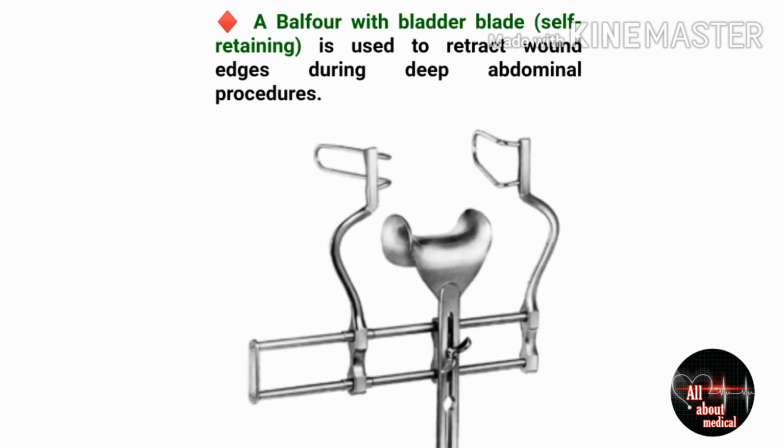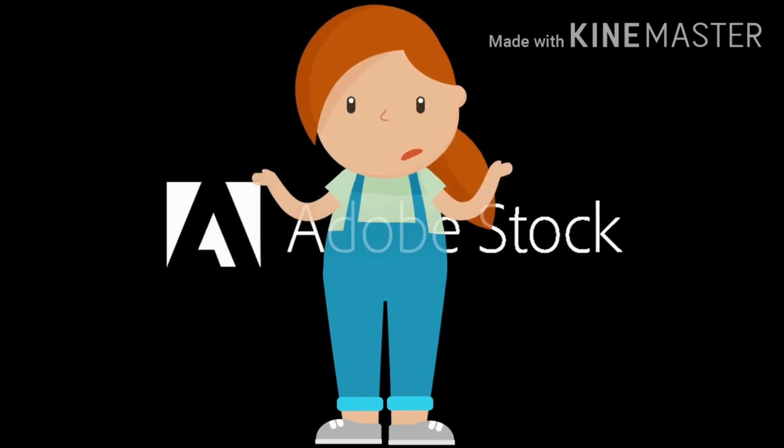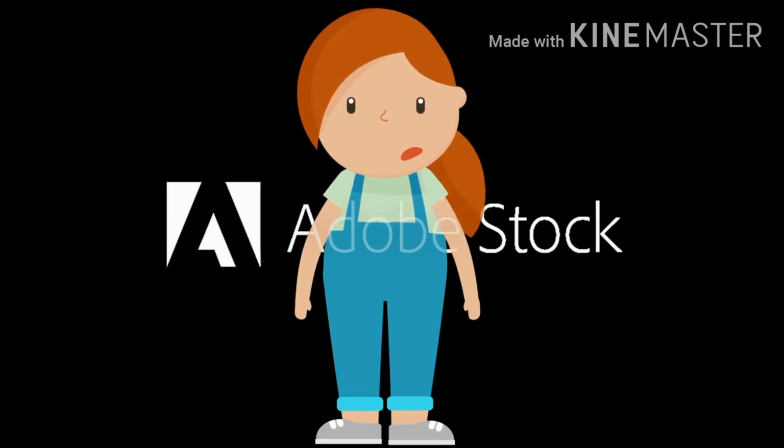And now this is our last and third self-retaining instrument, named Balfour with bladder blade, and it is used to retract wound edges during deep abdominal procedures. Yes, this is the last image of this video, and you can see the image of this instrument very clearly. It is self-retaining.